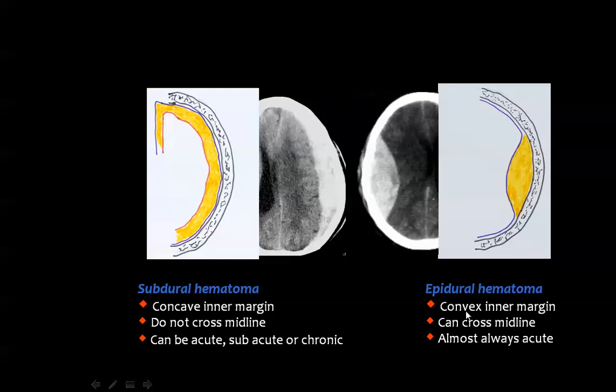The epidural hematoma has a convex inner margin, because you know that the dura represents the periosteum of the calvarium, and this is a very tight space, and the extension of the hematoma up and down is very limited, but the enlargement of the hematoma from its middle can occur easily. Then you see epidural blood with a convex inner border, but the subdural space is wide, and the hematoma can have the contour of the surface of the cerebral hemisphere.